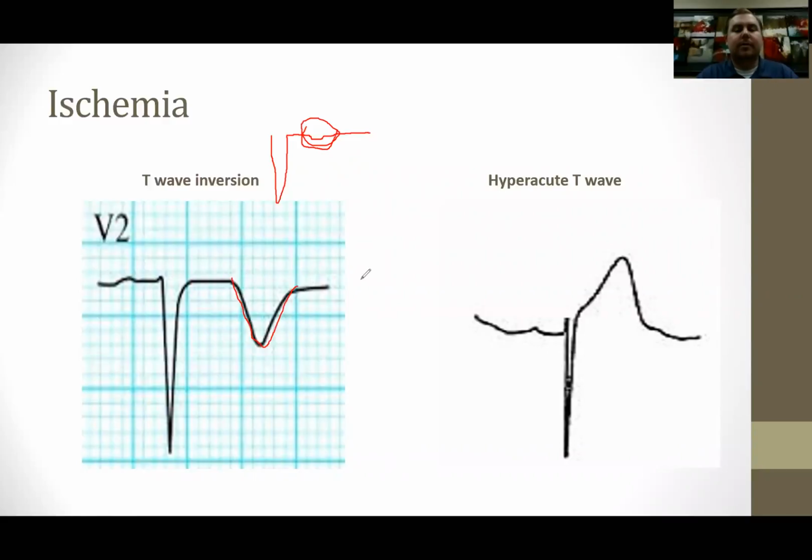You can also have T-waves that are really large that drop below the isoelectric line before they end. So QRS right here, which my drawing's not very good. So QRS, and then a T-wave that's real big, and then it even drops below and it's negative for a bit. These are called biphasic T-waves. And biphasic T-waves are usually a sign of true ischemia. There's a syndrome out there called Wellens syndrome that really gets into these types of biphasic T-waves.